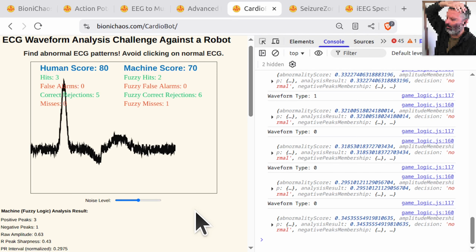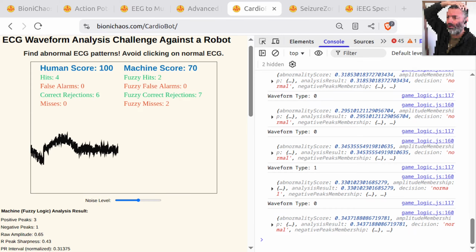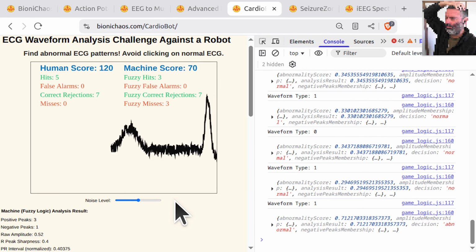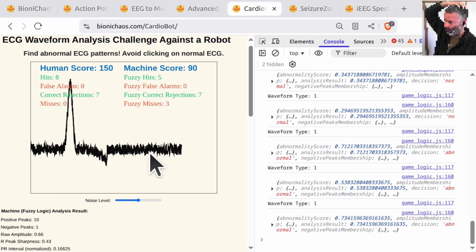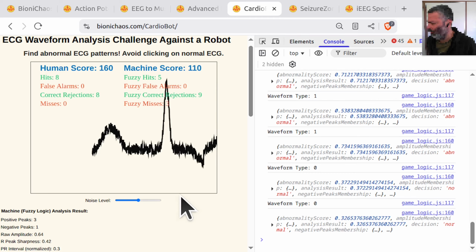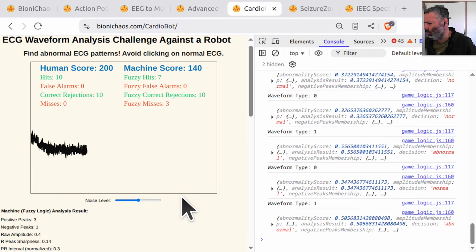But the real technical detail is what the tool is generating. It's not just normal sinus rhythm. The pathologies. The tool generates or loads rhythms with deviations. I'm guessing it throws in premature ventricular contractions, PVCs, maybe some atrial fibrillation, AFib, or perhaps an oddly prolonged QT interval? Precisely. It trains the user to spot those critical anomalies. The difficulty scales, and the tool provides immediate feedback on why your annotation was right or wrong. It is turning medical data labeling, a traditionally tedious, specialized task, into a gamified, competitive sprint.